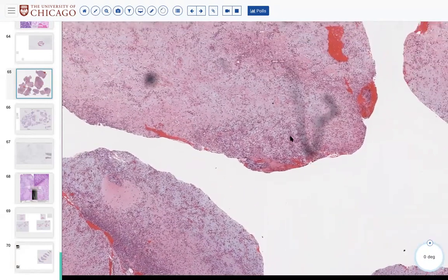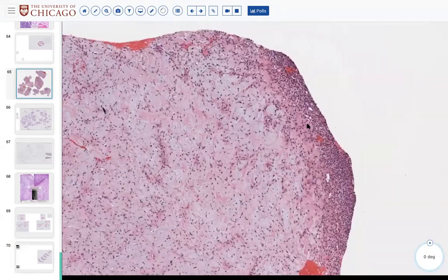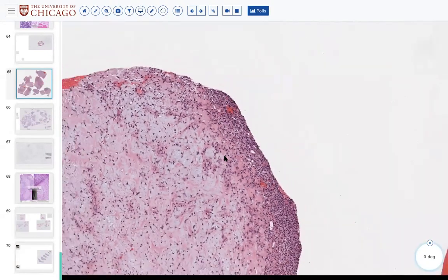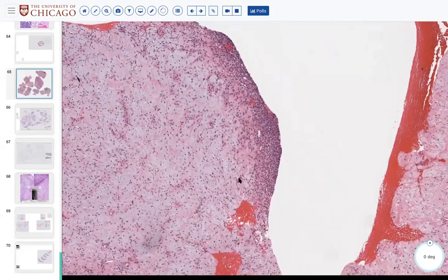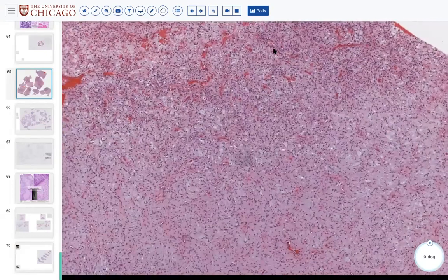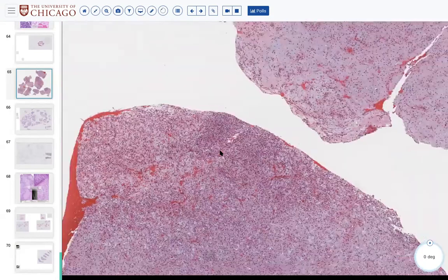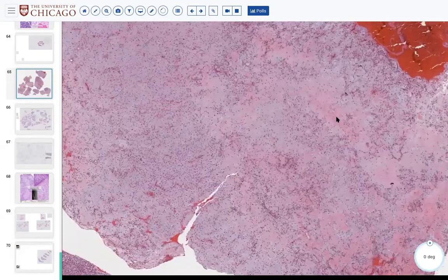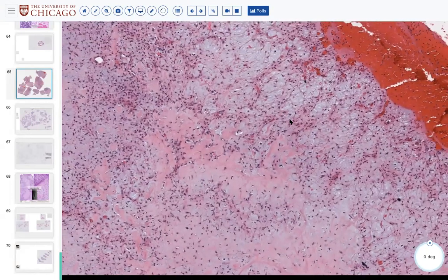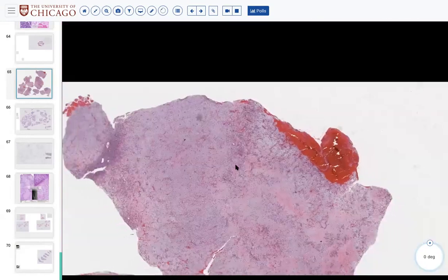And Perry says chondromyxoid fibroma, question mark. So tell us what you know about chondromyxoid fibroma. Not much. I think the edges, the periphery, can be a bit busier. I think it has that compressed, spindly cell look. The background, I think, is sort of chondromyxoid, which I suppose would fit with this as well. I think the busyness at the edge was maybe a good hint.